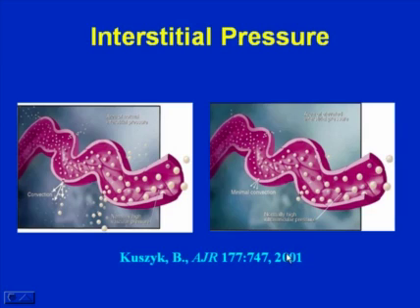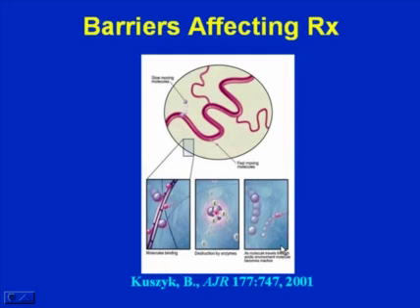And as you can see, whether or not the microbubble passes into the tissue is related significantly to the interstitial pressure. This has implications as to not only how we image them, but how the chemotherapeutic agents get into the tissue and fight the cancer.